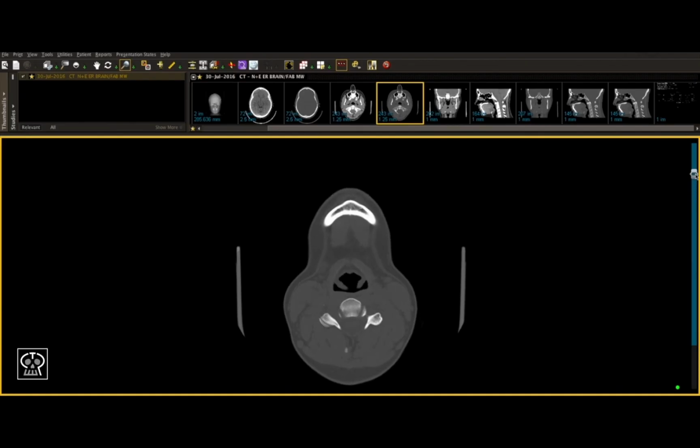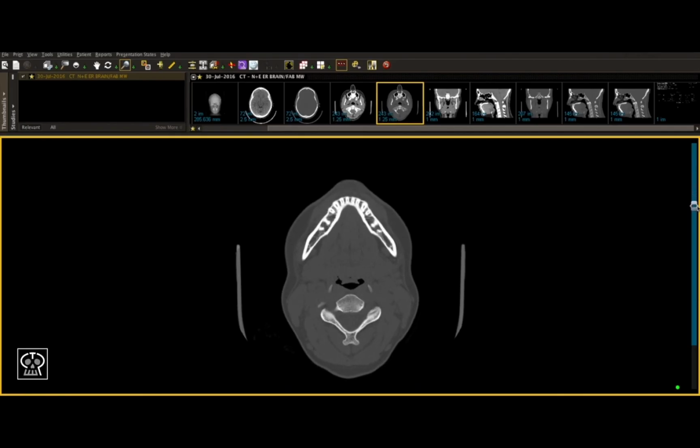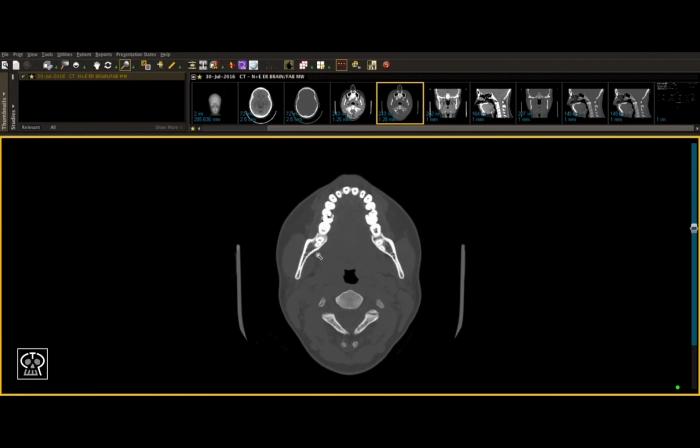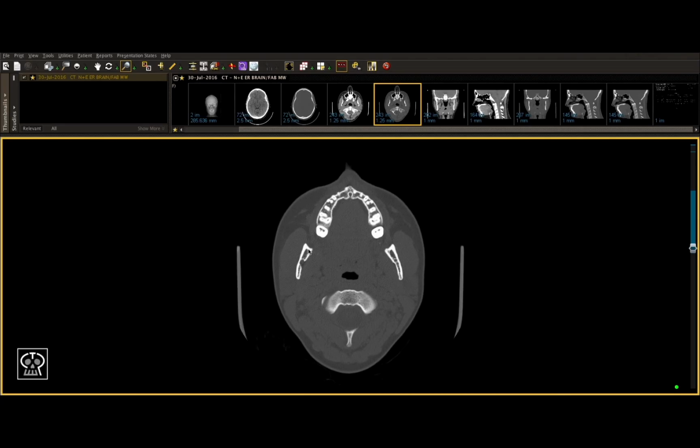So, starting from the bottom, we're looking at the cortices. We don't see any obvious breaks. It seems to be smooth everywhere. We're beginning to see the roots of the teeth. We keep scrolling up. Now, we see that break where it's transitioning to the maxilla, so now I'm only focusing on this side. This is the right body of the mandible trending towards the angle area, and I'm still looking for any breaks in the cortices or anything that seems to be out of order. So as we continue to scroll up on the right side, we've passed our angle and now we're going up the ascending ramus.